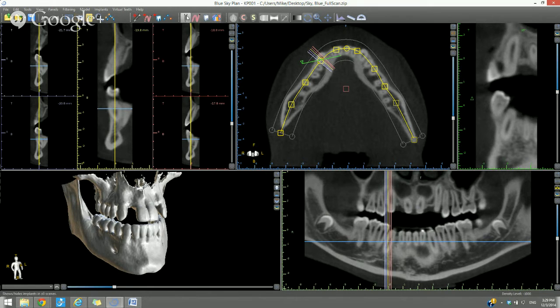So that's a little bit of information regarding that. For example, if the colorful indicating lines are in our way, we could just press the button and they disappear, clearing up our screen. Press it again, and it comes back. So that's some organizational information regarding how the toolbar is structured.